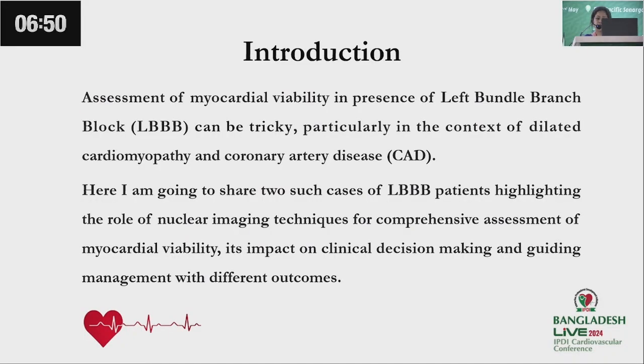Assessment of myocardial viability in the presence of left bundle branch block can be tricky, particularly in the context of dilated cardiomyopathy and coronary artery disease. Here I am going to share two such cases of LBBB patients, highlighting the role of nuclear imaging techniques for comprehensive assessment of myocardial viability, its impact on clinical decision making and guiding management with different outcomes.